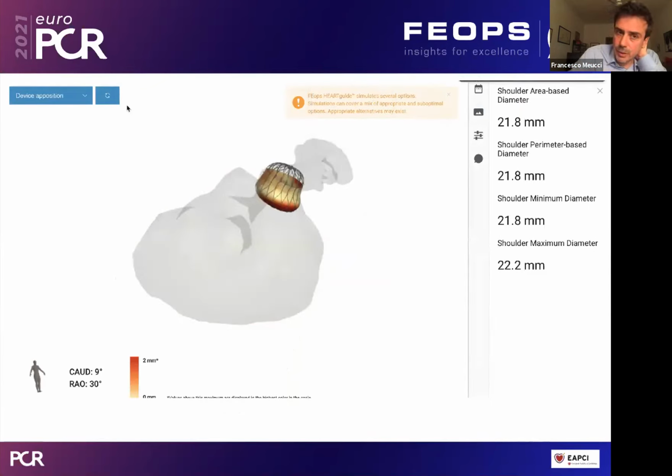If I implant the 27, I definitely have a good compression. Also proximally, which is not my favorite deformation of the device, it is 14%, so it is acceptable. If I implant the 27 a little bit more inside, more distally, and I have room in this appendage to go a little bit more distally, the compression is 17%, so it is definitely good. The biggest device for this appendage, the 31, has a much greater compression, 22%.